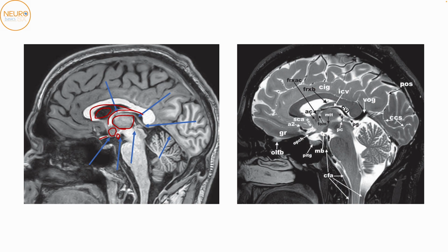This here again is a T1 hyperintense structure. So that is your posterior commissure over here. This is the cerebellum. The fourth ventricle, the superior cerebellar peduncle. This structure over here running like this is T1 isointense, but as we can see on T2, it is quite hypo. This is a blood vessel. This is the internal cerebral vein forming the vein of Galen over here.